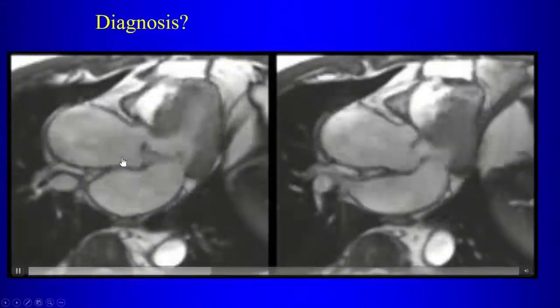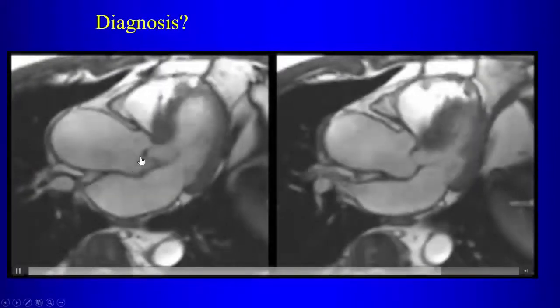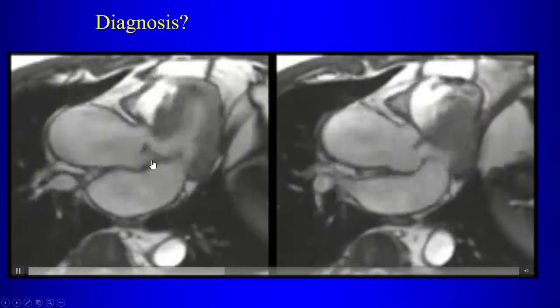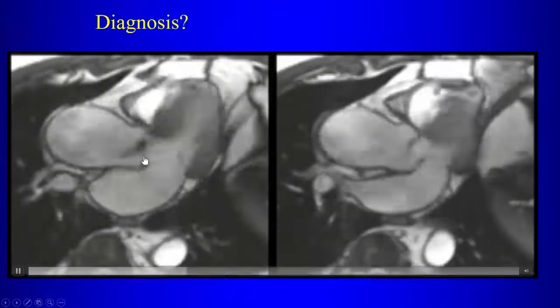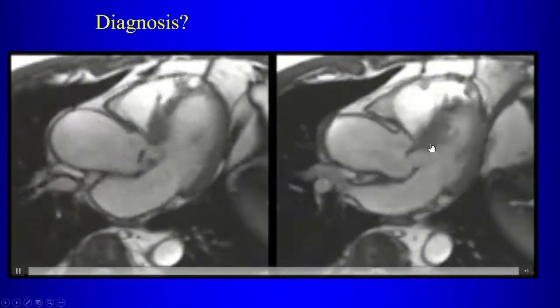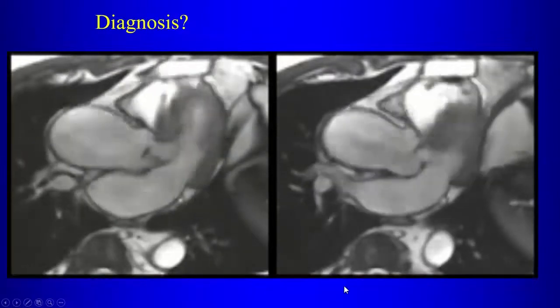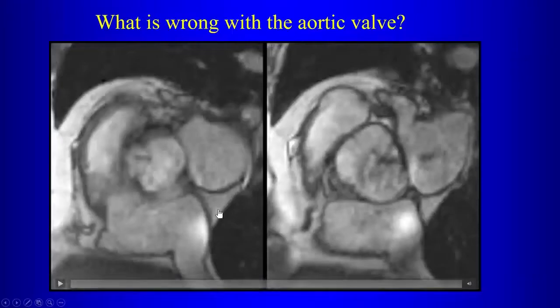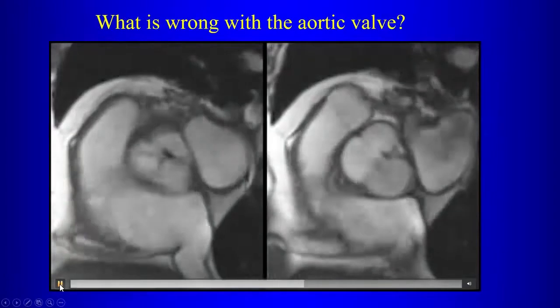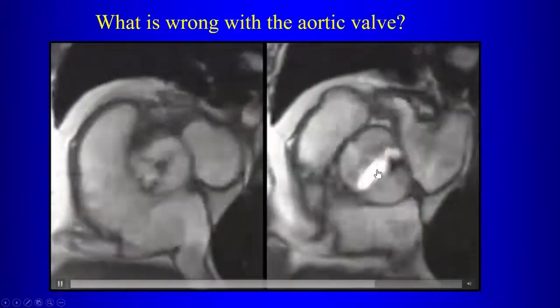In our next example, we're looking at a left ventricular outflow tract view. Again, we can see that there is a flow jet here in systole above the aortic valve, so there is aortic valvular stenosis. Notice there's post-stenotic dilatation. There's also some dark signal on the aortic valve suggesting calcification, but we also have aortic valvular regurgitation. We can see a regurgitant jet during diastole coming down and hitting the anterior leaflet of the mitral valve, which is typical of aortic valvular regurgitation on these views.